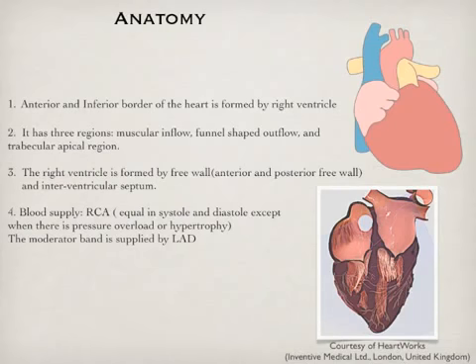In the short axis, it should appear significantly smaller than the left ventricle and has sometimes been described as a hand, RV, on a basketball, LV. The right ventricle is formed by a free wall comprised of anterior and posterior components and the interventricular septum.